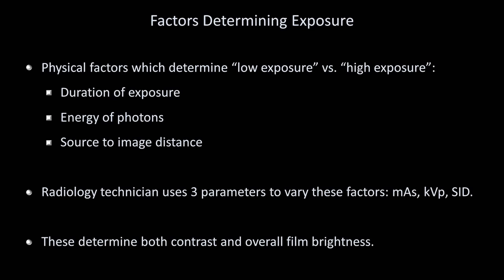Otherwise, clinicians would not be able to tell if changes that occurred from one X-ray to the next were due to an actual change in clinical status, such as increasing or decreasing pulmonary edema, or were due to difference in radiographic technique.